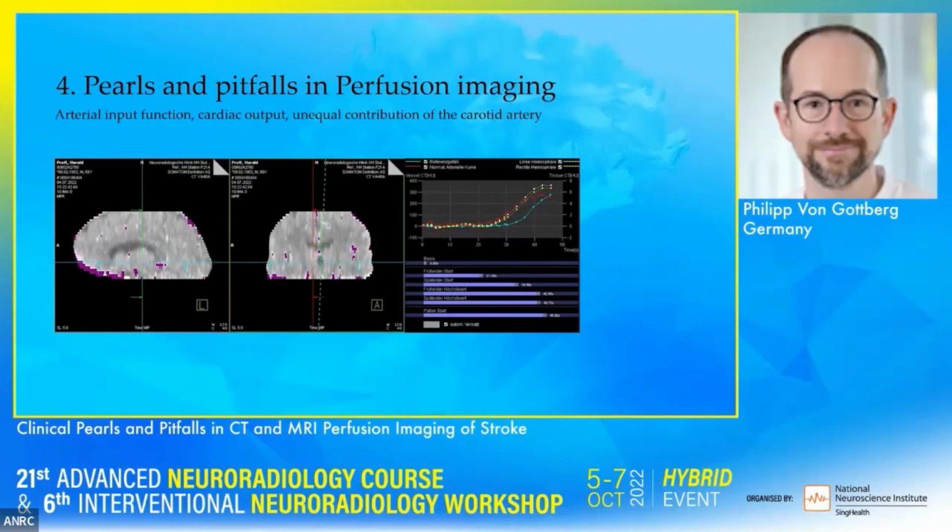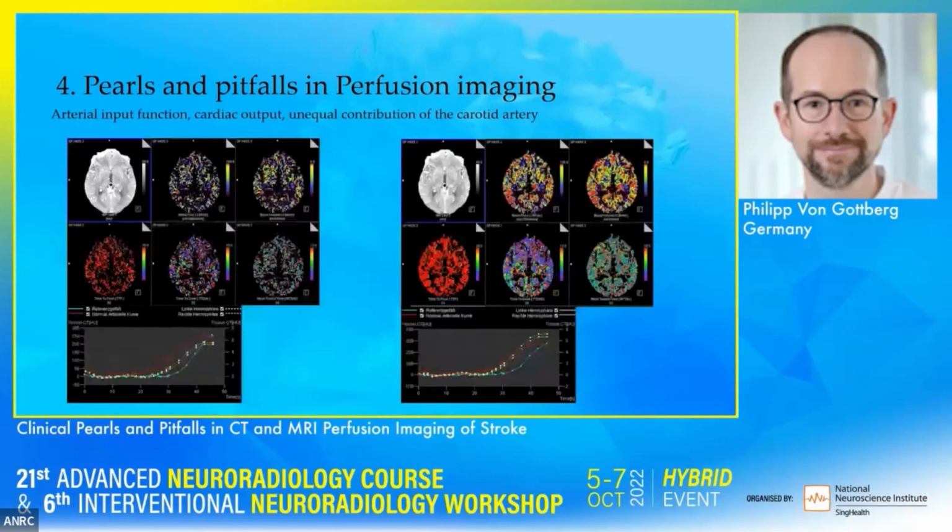So if we set up the threshold, the level after which the concentration in the part of the brain will be considered a vessel, then we can smoothen these curves, and we can eventually have here, as you can see, a readable perfusion image despite this cardiac output insufficiency.